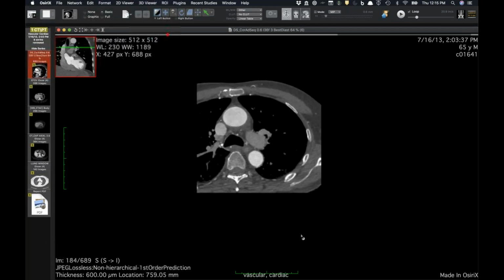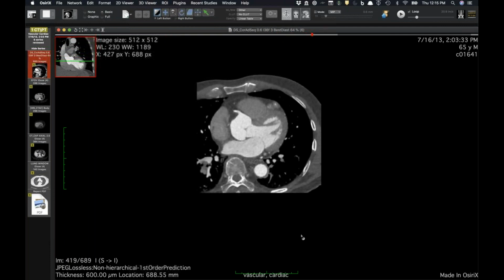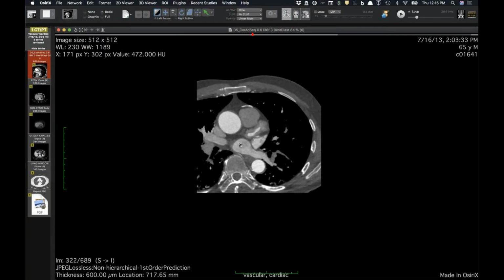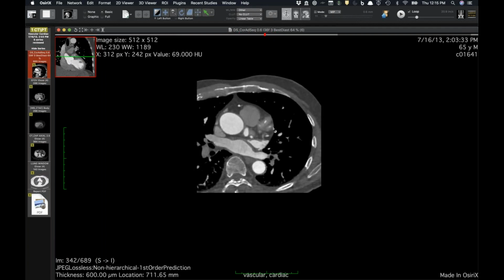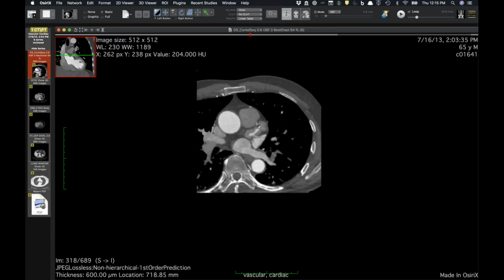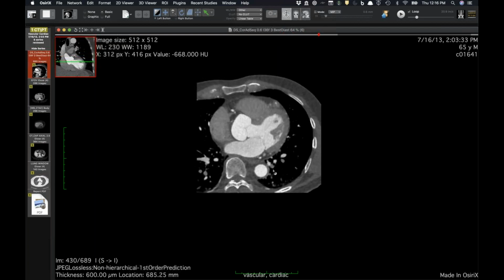Has he had like a stress test? Does he actually have, because it doesn't look narrowed. It just, no, the vessels actually look really. Right. And I know you've shown cases of peri-aortitis from IgG4, and I think I saw one at Emory, but this is just crazy. Yeah, that's pretty impressive. So, wow.